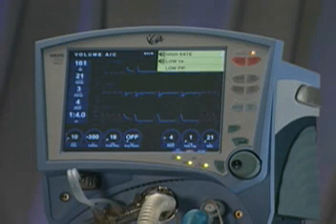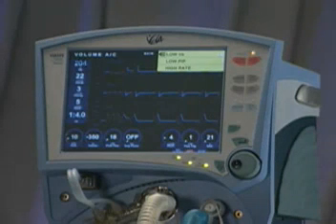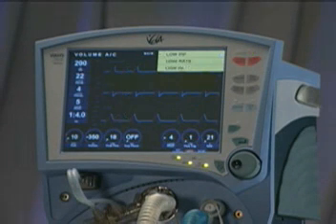Medium priority alarms are audible alarms with a yellow bar and flashing icon. Low priority alarms are visual indicators that display the alarm icon on a solid yellow banner. All resolved alarms are displayed as a solid yellow bar with no alarm icon present.